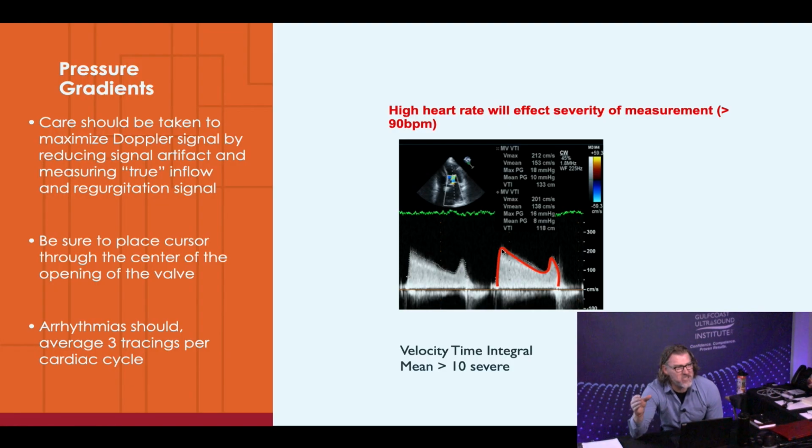What happens to our diastolic filling? Diastolic filling compresses. It shortens. We don't have as much time to fill. So what happens to our E and our A wave? If our diastolic time frame shortens, this is going to compress. When that compresses, what happens to this value here?